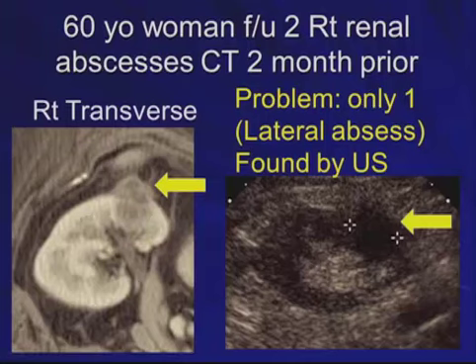Well, here's another case in which ultrasound co-registration saved us. A 60-year-old woman had 2 renal abscesses, had actually been followed by CTs multiple times, but the clinicians finally realized, gee, maybe we should reduce the patient's radiation exposure and follow this patient up with ultrasound.